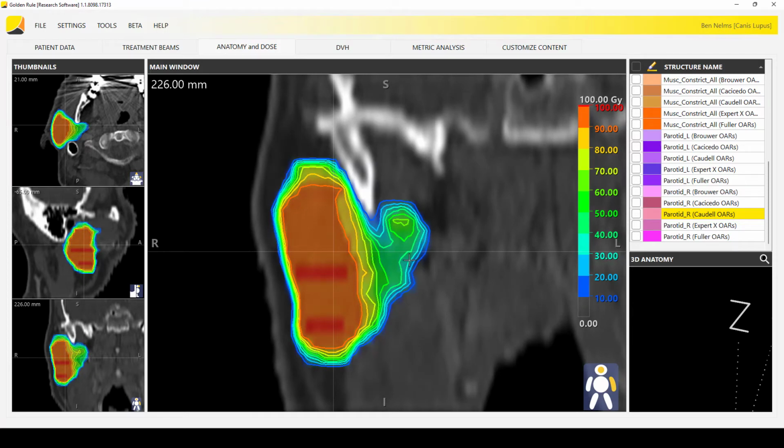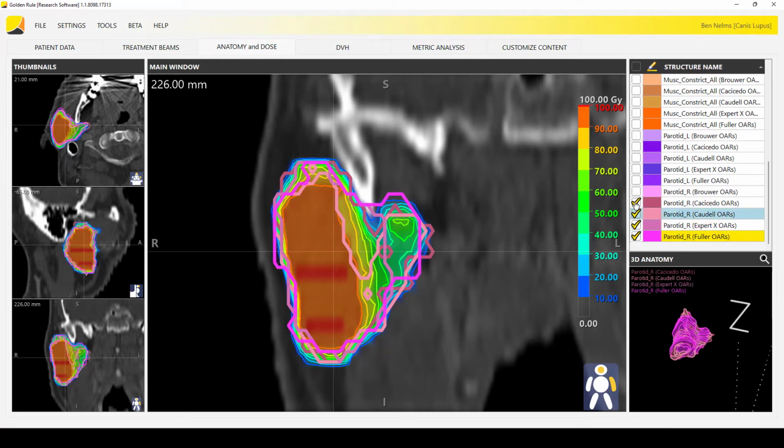Now in this particular case, our experts, by and large, turn them on again, are taking the perspective of incorporating this region of disagreement, incorporating it all.